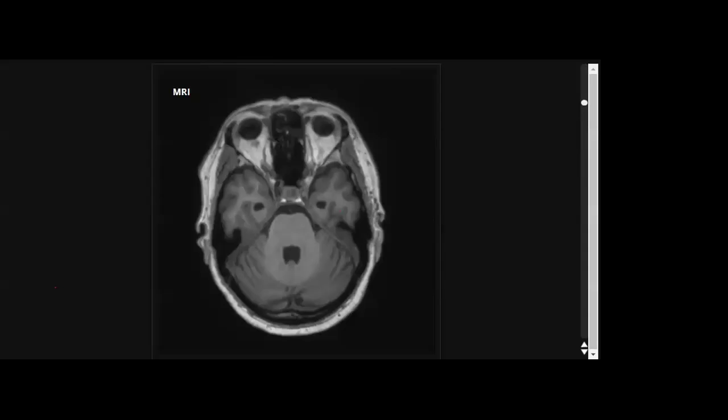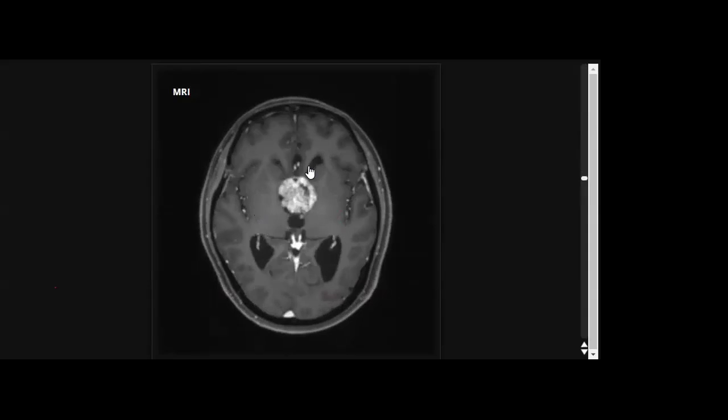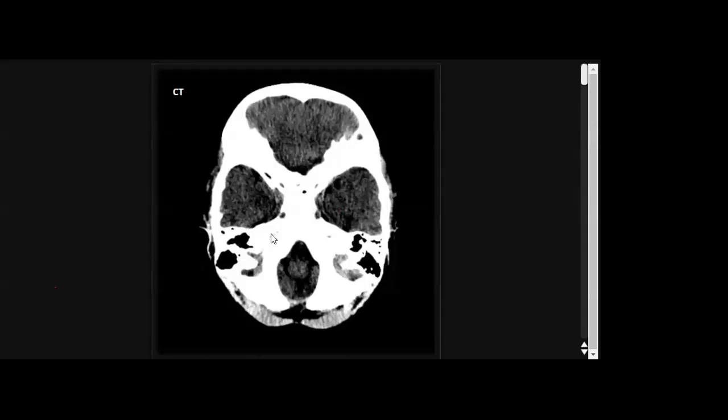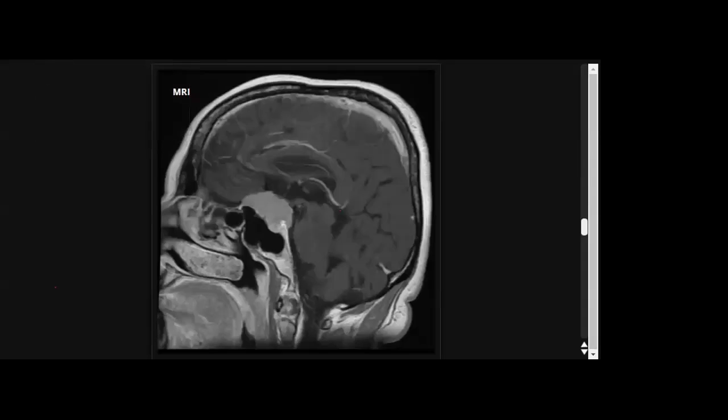Yes, this case is a totally enhancing suprasellar lesion in an adult. One of the possibilities is papillary type. Papillary in adult, adamantinomatous in pediatric. Okay, so if the suprasellar lesion is predominantly cystic in pediatric age group with some calcification, this is adamantinomatous craniopharyngioma.